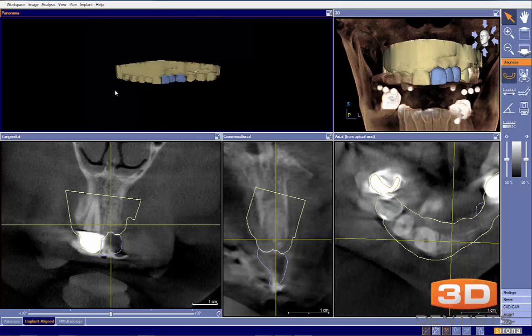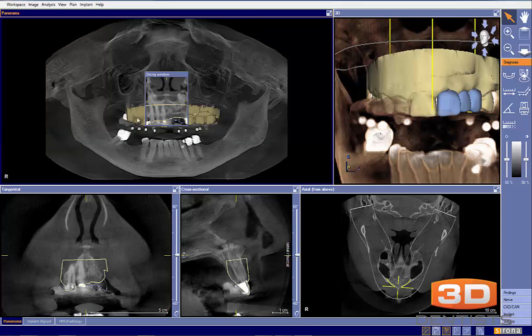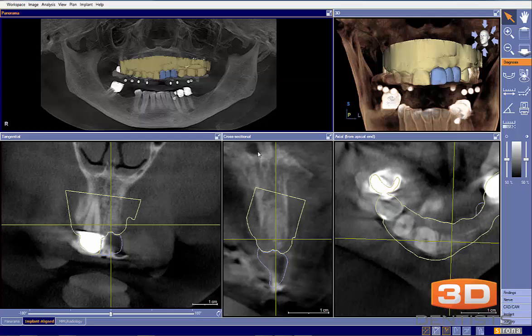I was waiting to see if it made a liar of me. And here it comes. It should be updating here in a second now. So let's take a peek here. There we go. Our panorama view is updated, as you can see here, and now we can see how this looks a little bit more normal compared to what we started with. Again, not a necessary step, but one of the things I like to take a look at just to have everything working nicely.